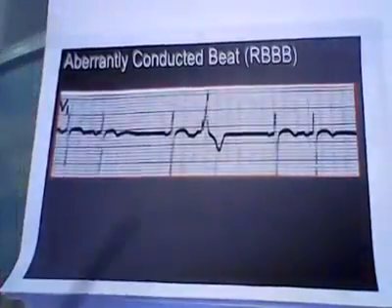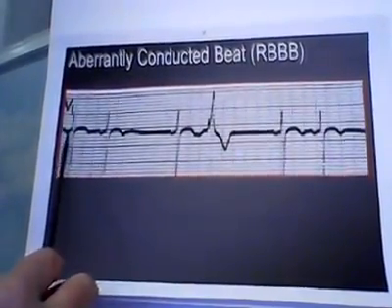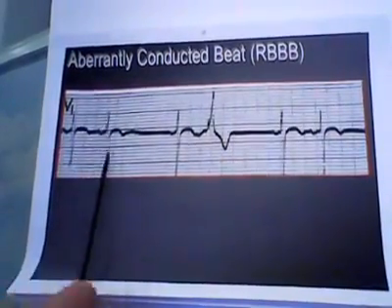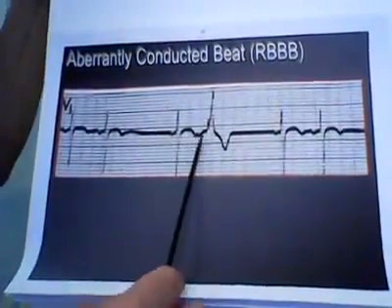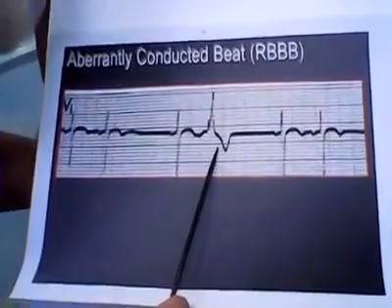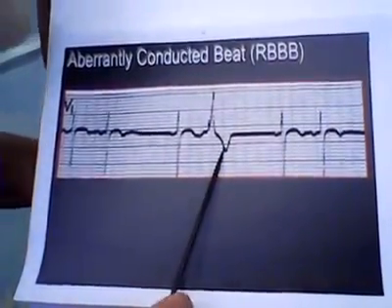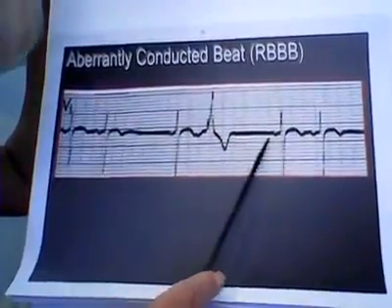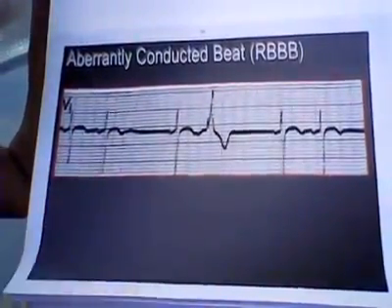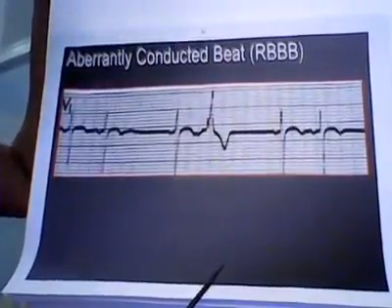Now, I'm looking at this, right? P wave, QRST. P, QRST. We have a pause, then P, QRST, and then we do this. Some people call that a PVC. It's not a PVC. They're like, oh, yes, it is, Gasparis. You're wrong. It's a PVC. The T wave is opposite. We have a compensatory pause. It's not a PVC. It's a PAC that got aberrantly conducted.